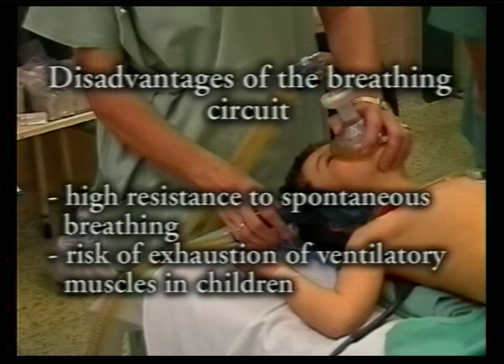The resistance of the breathing system, which it exerts during spontaneous ventilation, can increase muscle work, and with small children it can lead to exhaustion. In pediatric patients, one-way systems are used where there are no valves and expiration and inspiration are separated only by fresh gas inflow, exerting a minimum resistance to breathing.